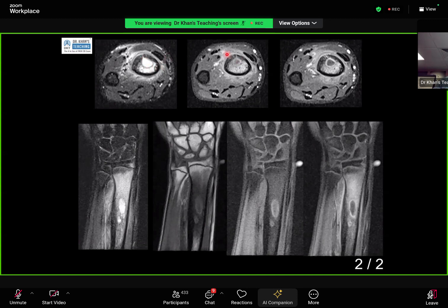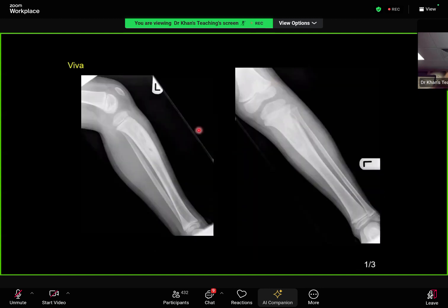I'm presented with leg radiographs of a skeletally immature patient. There is ill-defined lucency seen at the proximal shaft of the left tibia with surrounding cortical thickening and sclerosis. There is also periosteal reaction seen on the AP radiograph, I think medially.